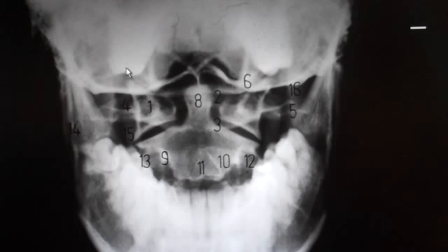This is a molar. We have down here an impacted wisdom tooth. You see how the teeth root is coming out right here, and so it's coming in sideways. That is called an impacted wisdom tooth. And I believe that that's everything that I usually point out on that film.